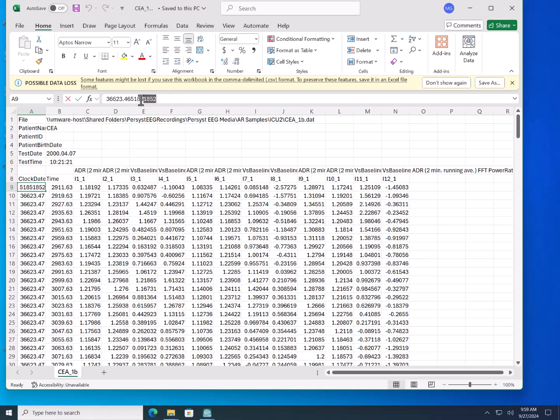And you can see that, if we go up here, there is indeed lots of precision, but yes, it gives you the percentage of a day forward, and this first part is the date. That's calculated. You can look it up on the web to see how Microsoft OLE time is implemented, but anyway, that's what's been exported. That's why you get all these columns.